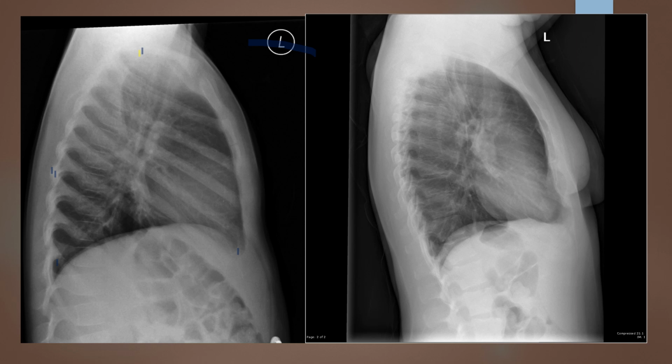That looks like a fantastic positioning there. We're also going to look at the sternum. The sternum looks in profile. I do not see any heart shadow anterior to it. I don't see any lungs anterior to it, so indicating that we have a good mid-coronal plane here. Mid-sagittal plane then is also good, so we're going to go ahead and skip to our mid-coronal tilt.